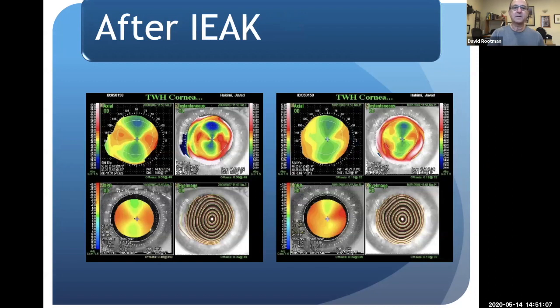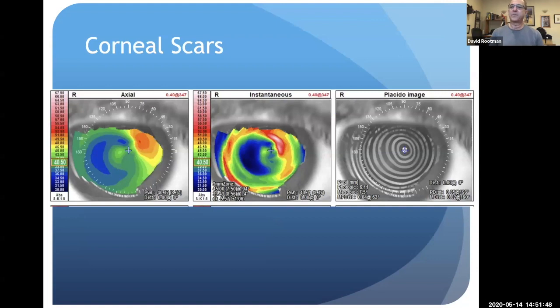And here's a clinical example. This patient has high astigmatism with the axis at about 165. Look at the rings. They're quite oval. So we're looking at 11 diopters of astigmatism. And this is after the first treatment. The astigmatism was reduced down to 5.69. The center circle is much more round, much more regular. And in this patient's instance, I actually went back a second time and was able to reduce his astigmatism to an amount correctable with glasses.